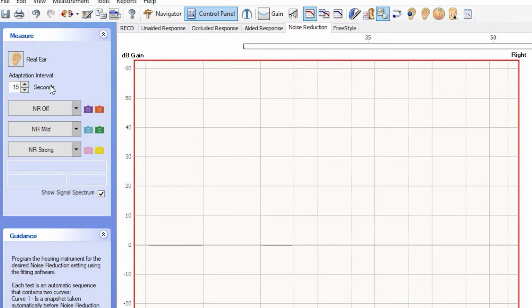in the control panel. If you are using the Aurical Hit Test Chamber, be sure to select 2cc coupler in the control panel, or select the coupler-based fitting icon in the toolbar. Also, be sure to designate the side being tested by selecting right or left in the toolbar.